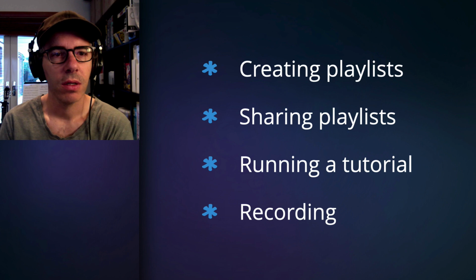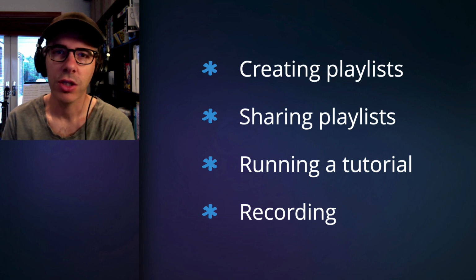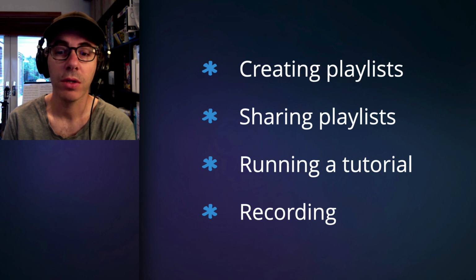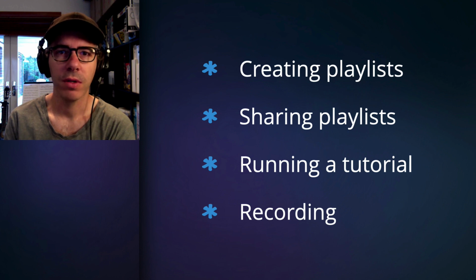We'll be covering a few things this morning, primarily how to create a playlist, how to then share a playlist to make it work effectively during a tutorial. And then if you want to record it, just a couple of tips and tricks.